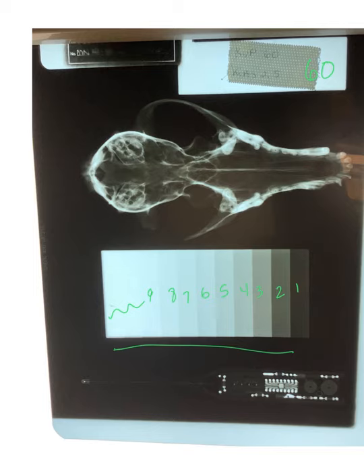So we had a lot more force, so we can see a lot more definition in these steps. Here we had enough force to get all the way through up here. Back when we did only the 40, we were stuck about here on these steps. More force, more x-rays got through, we were able to get through thicker structures. More x-rays are going to hit the image receptor, and we're going to have a darker looking x-ray like you can see up on this one. So here, if we look up at the skull, we're going to see a lot more blackness on this x-ray than we did before. Throughout all of these areas, things that were bright white before are now becoming a darker color.